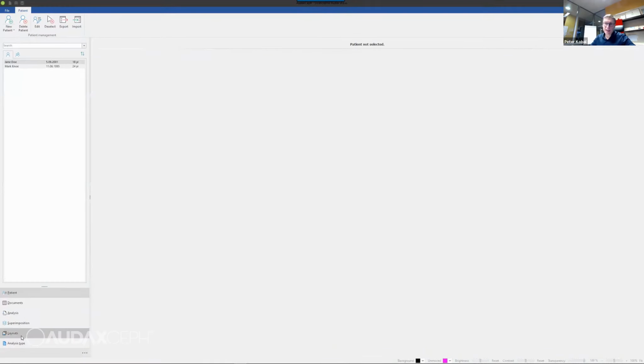Then module selection, we switched between layouts here and analysis type. So we had before, I don't know, photograph or photograph something, and now we switched that and we named it layout. So if you are looking for images, you will find them here.